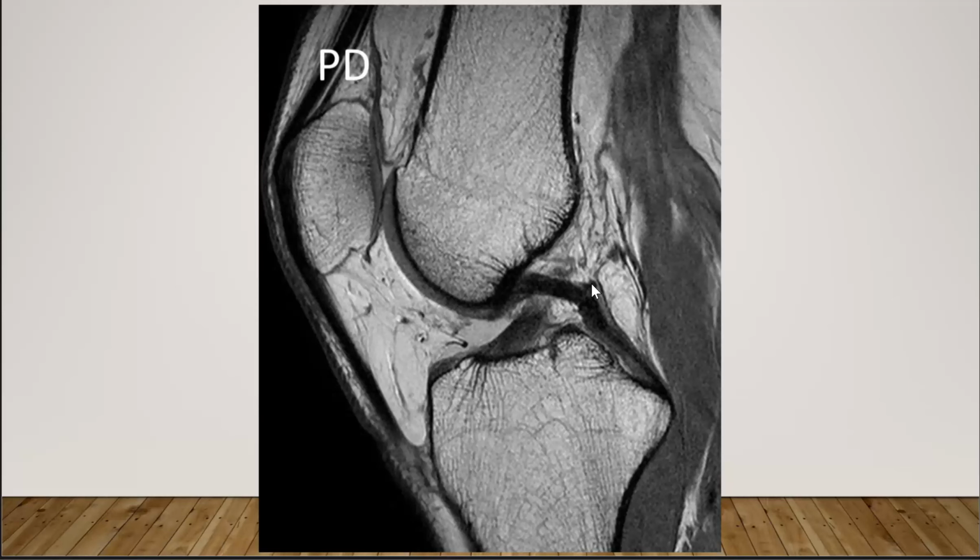Either the Wrisberg ligament or the Humphrey ligament can be present in about 70% of knee MRI.